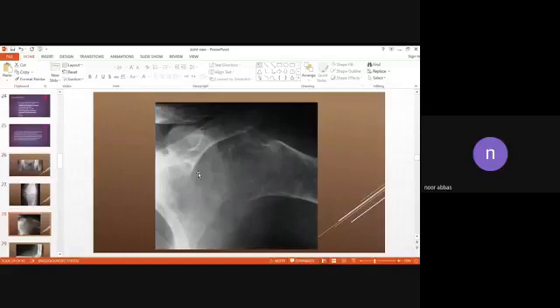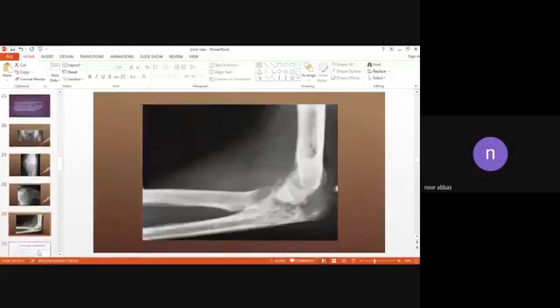This is a joint involved by tuberculosis arthritis, as we can see here that there is changes of the joint and changes on both ends of the joint. We can see here the gross demineralization and the gross osteoporosis, and will be followed by extensive cortical erosions and even destruction. This is also an example of an elbow involved by tuberculosis arthritis, and we see here the gross demineralization and the involvement by erosions. Basically similar to septic arthritis, but with appearance of gross osteoporosis and demineralization.